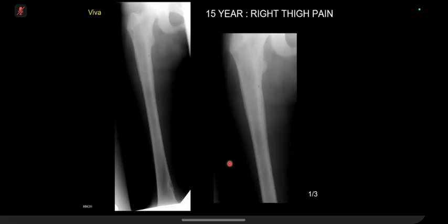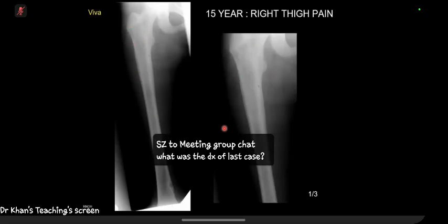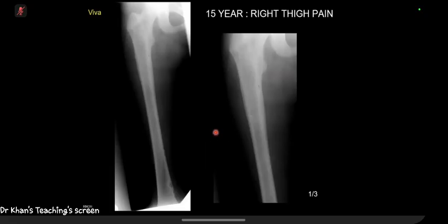So in the proximal femur, there appears to be a periosteal reaction on the lateral aspect, and on the distal. Yeah, so this thing is a fibrous cortical defect. You have picked up a periosteal reaction. Do you think this is a normal marrow here? No. Close up. No, the marrow appears to be heterogeneous and slightly sclerotic. What will you do next?